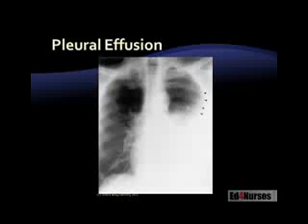Here, a patient has a pleural effusion. Okay, now notice on the left-hand side of your screen, that right lung, nice and fully expanded. We got nice diaphragmatic arches, costophrenic angles, but look at the right. On the right side of your screen, which is the left lung, we lost half the lung there, right? Now, how do you know this isn't pneumonia? We know it isn't pneumonia because we see the pleura pulling away from the chest wall. Let me highlight it for you.